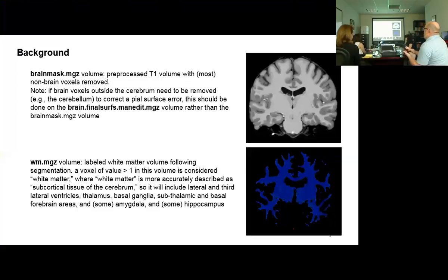I'm sorry, on the gray and white matter intensity. So it tries to find what it thinks is white matter, like an initial attempt, and then it tries to normalize that white matter intensity to a single value where it can. So if you're familiar with looking at T1 volumes that come right off the scanner, they're not nearly this.